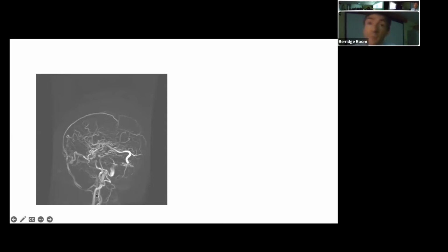I think one of these is the jugular vein as well, so that there are two carotids and at least one vertebral artery. But intracranially, you can't see much of the venous system until you get to this point. I think that's one of the sigmoid sinuses, and maybe some attenuated flow in one of the transverse sinuses. But this is showing extensive venous sinus thrombosis.